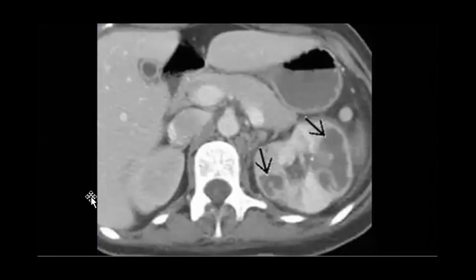So what about this image? An intrarenal lesion. But I see that many of us rush to infection, maybe abscess, yeah. Because you can see there is distortion of the renal parenchyma and multiple non-enhancing areas, and Ala mentioned that there is fat stranding as well.